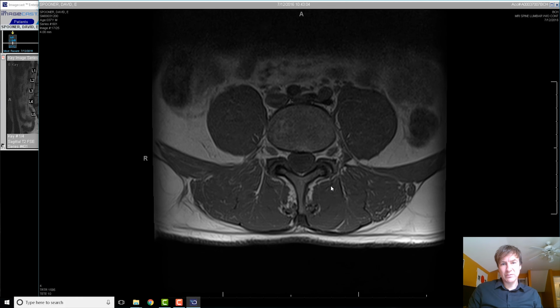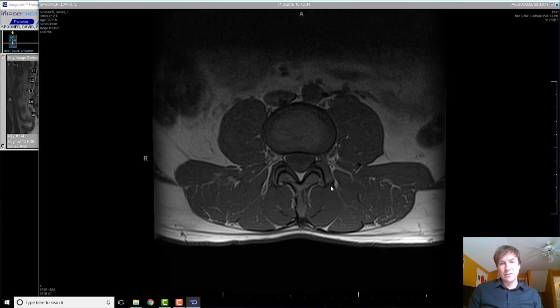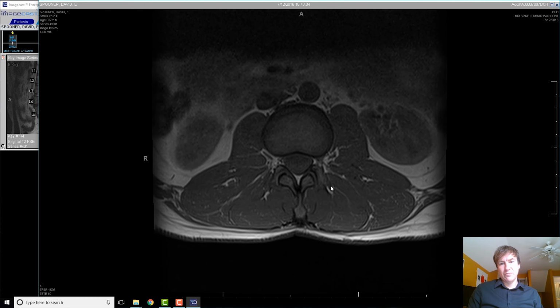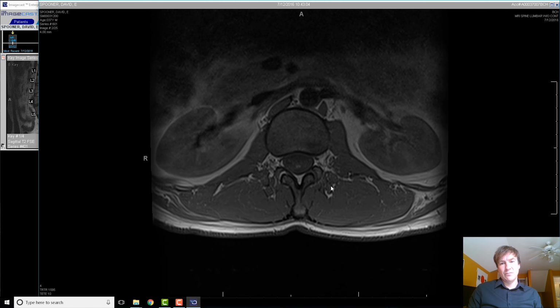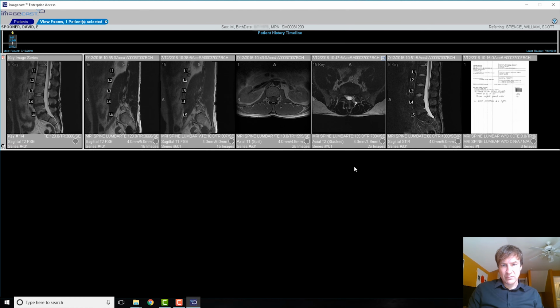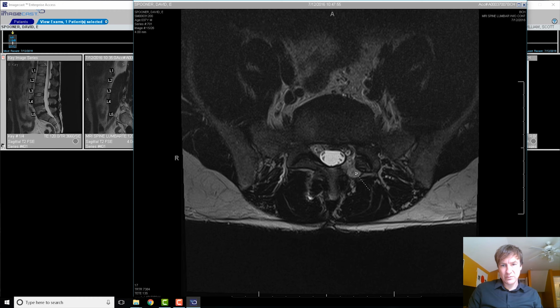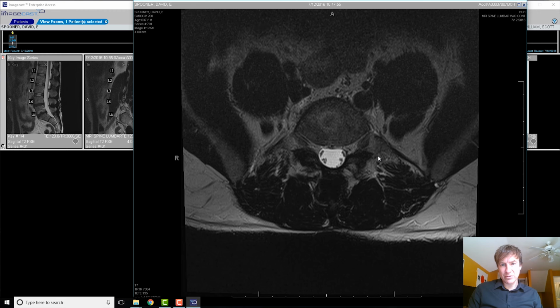L4, L5 disc, I believe. All right. Forward. Try not to comment too much, because like I said, this video is probably going to be long by the time I finish, as it is.